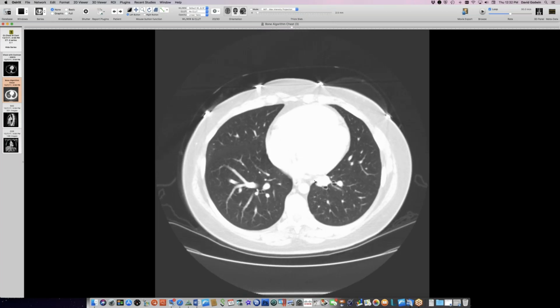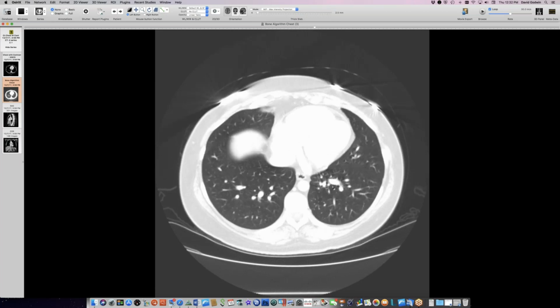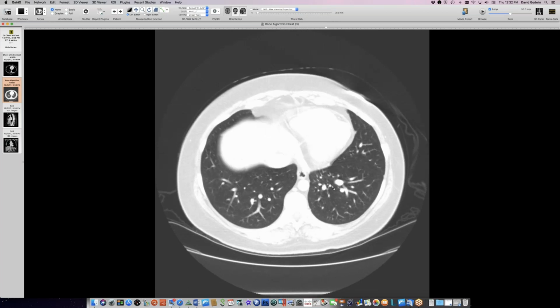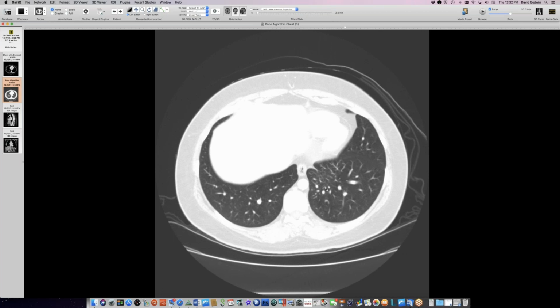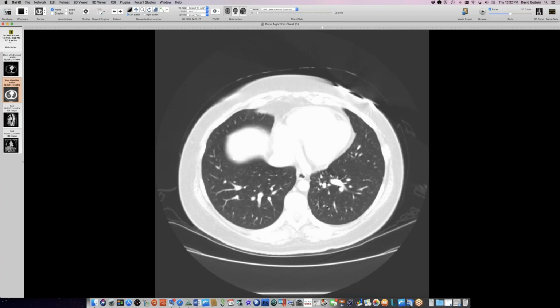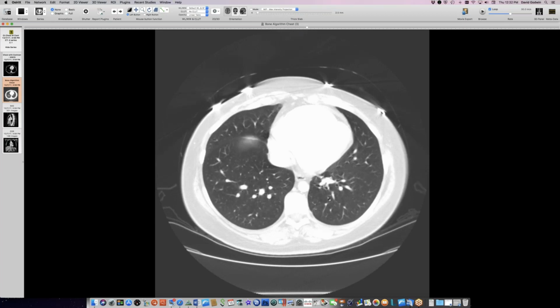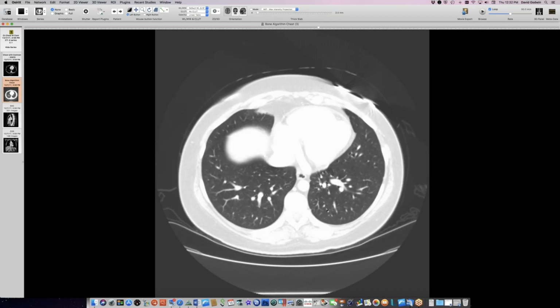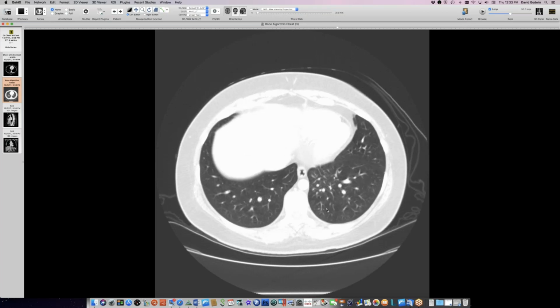And that's probably because we've got systemic artery pressures here perfusing the lung, and so we probably enlarge some of these otherwise small vessels that wouldn't show up, and so we have a larger number of vessels because we've got this increased perfusion going on down there. Now, there's not an arteriovenous connection here, so it's not AVM, and it's robustly not sequestration, because notice the airways. We've got a normal complement of our airways in this region, rather than isolation from the airway system, which is where sequestration gets its name.